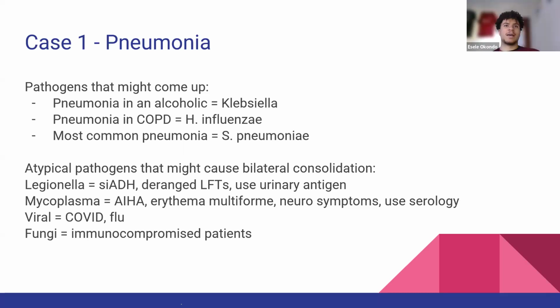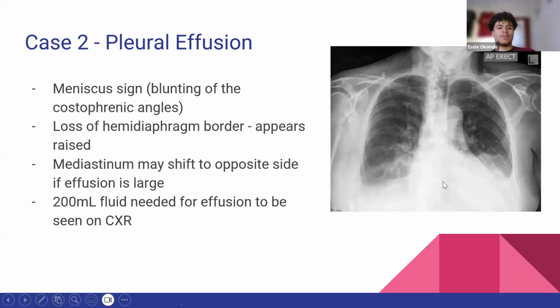Yep, very good. Everyone got the right diagnosis, which is pleural effusion. A couple of people said pleural effusion specifically secondary to a tumor. Pleural effusion doesn't have to be secondary to a tumor. There's a variety of things which can cause a pleural effusion. Cancer is one of those, definitely, but it's always important to keep a wide differential.